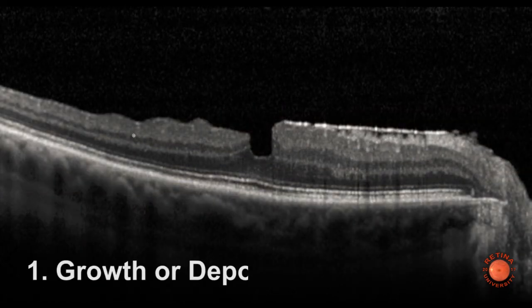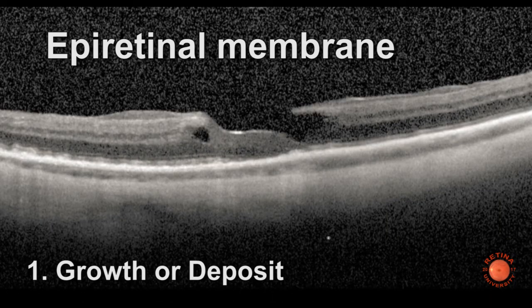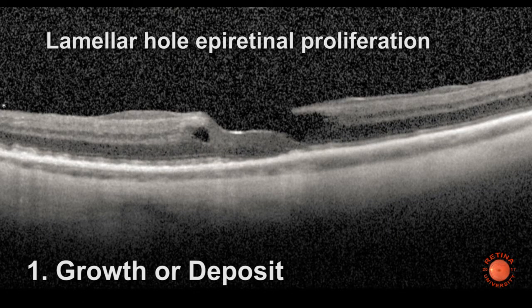Starting off with something that shouldn't be there, one of the most common things you'll see on these line scans is an epiretinal membrane. It's a bright line, usually sitting in front of the retina. And sometimes there are little spaces between it and the retina, but sometimes it's not detached at all from the nerve fiber layer.